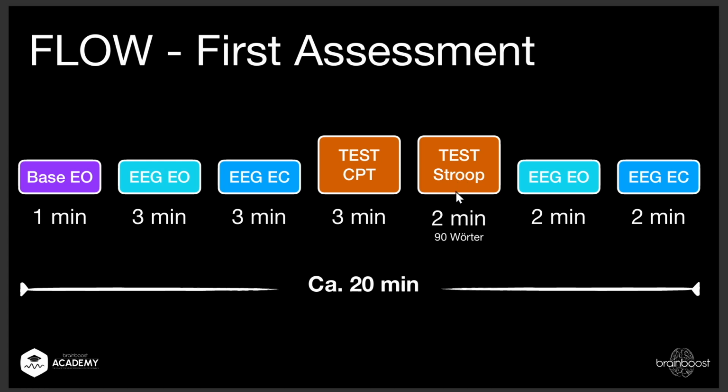yellow, blue, red? And then we have, after the stressor, which is pretty stressful, sometimes also to watch, then we have 2 minutes of eyes open again and 2 minutes of eyes closed. The auto report will just take the first 2 segments, eyes open, eyes closed. Our auto report, of course, we have different ones. Still, this might be nice for also analyzing in a deeper matter what happened there. So you can, of course, also create manual reports still.